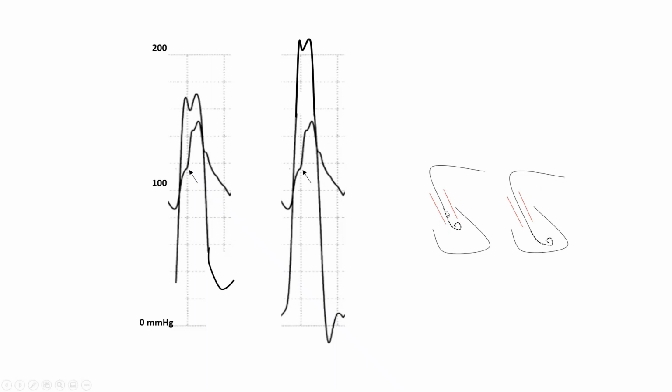And under X-ray, look where your catheter is and reposition it. A lot of the time you might be stuck in the mitral apparatus, so half of the catheter is in the mitral apparatus and half of it is across the aortic valve. When you have that error, you don't damp the tracing, you just damp the height. It's just that your LV is mixed, halfway aorta, halfway LV. It's just going through the steps and recognizing those three types of error. But again, I agree, this is not the damping type of error.